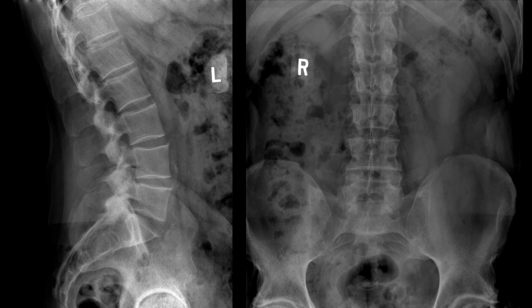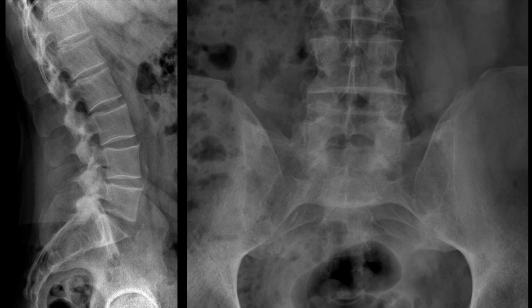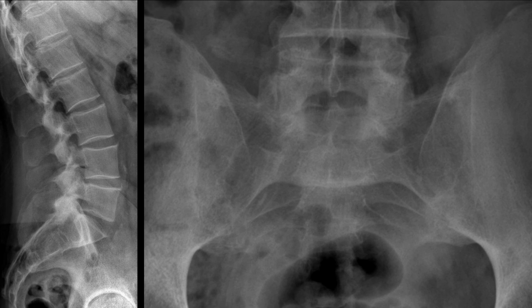And now let's take a look at the lumbar spine. We have frontal and lateral views, and I'll give you a few seconds to look at this before zooming into the key findings. An important radiographic finding in this case are poorly visualized sacroiliac articulations. Usually, the inferior aspect of the sacroiliac joints is clearly visible and delineated, and in this case, it's not well seen.